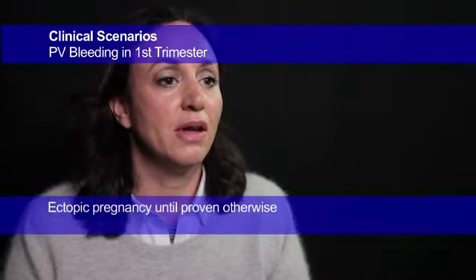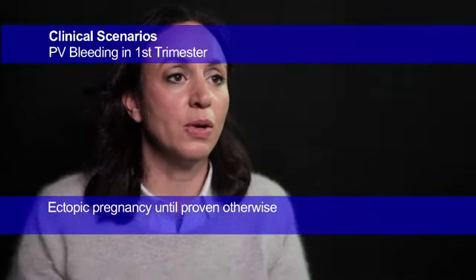Now we'll talk about some clinical scenarios and the use of early pregnancy scanning in those scenarios to help us diagnose and manage the patient. So if we consider the scenario of bleeding in the first trimester, this is a common presenting problem and must be taken very seriously. In the first instance, we've all been taught that any bleeding in the first trimester must be considered an ectopic pregnancy until proven otherwise.